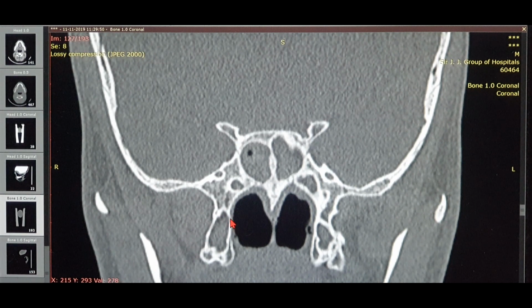So that's the choana, and you know that the lateral margin of the choana is formed by the medial pterygoid plate. You have to remember all these basics. Only then will you be able to have a rapid fire round with the examiner and pass. So these two holes you can see over here, always remember the rule.